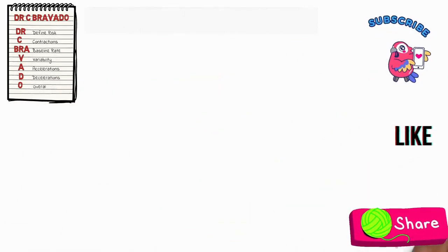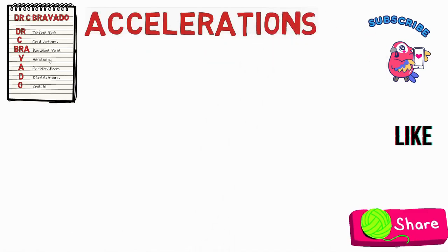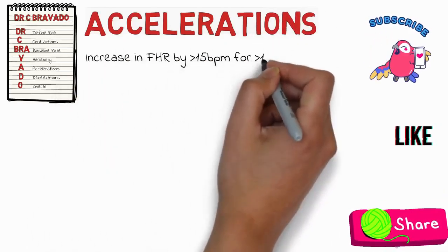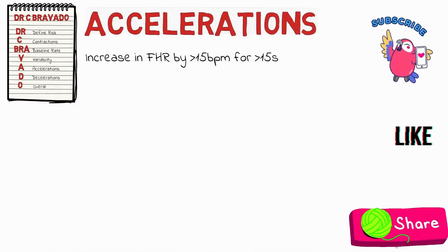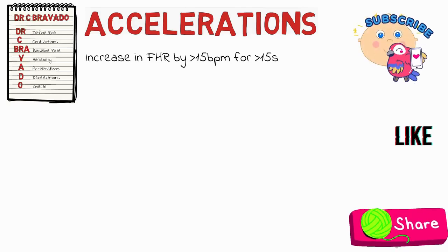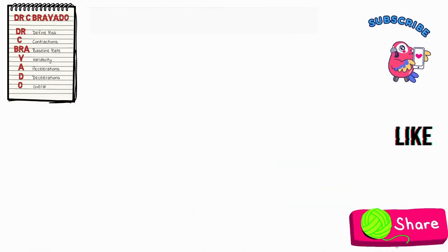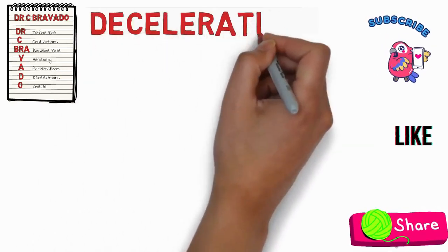Okay, so next up we've got accelerations. Accelerations are defined as an abrupt increase in fetal heart rate by more than 15 beats per minute for more than 15 seconds. Accelerations are a sign of a healthy fetus. In this CTG, we can see accelerations over here. Great, so next in our DR C BRAVADO mnemonic, we've got decelerations.